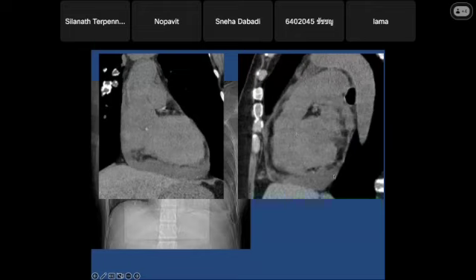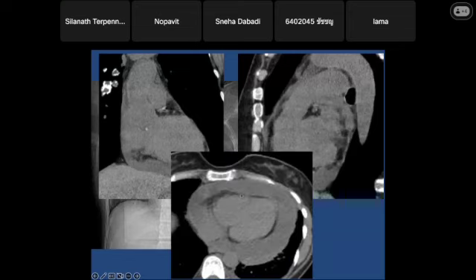When the patient is in the CT scanner, they lie down. So the free fluid will move to the posterior part of the pericardial cavity, here. So that's why it's piled up in the back. And this is on the axial. You see that? This is the heart, and this is the fluid. So seeing a big heart on chest radiograph may be dilated cardiomyopathy, very bad mitral valve disease, or maybe pericardial effusion. You don't know just by the imaging. You probably know by the clinical context, but not by the imaging.